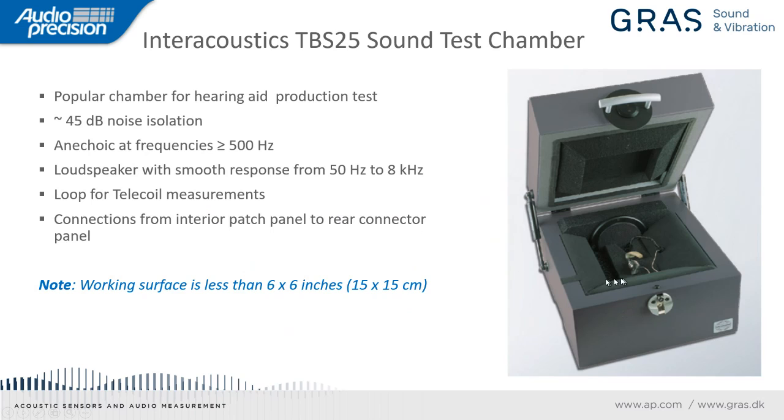And there's a patch panel in the front that you can't really see here that's connected to a patch panel on the back of the box, and that conveys many of the connections from inside the box to outside for convenience. I just wanted to point out here that the working surface inside the box is quite small. It's less than about 6 by 6 inches or about 15 by 15 centimeters. So really you don't have a lot of room to work inside the box, but luckily hearing aids are quite small, so it's definitely workable.